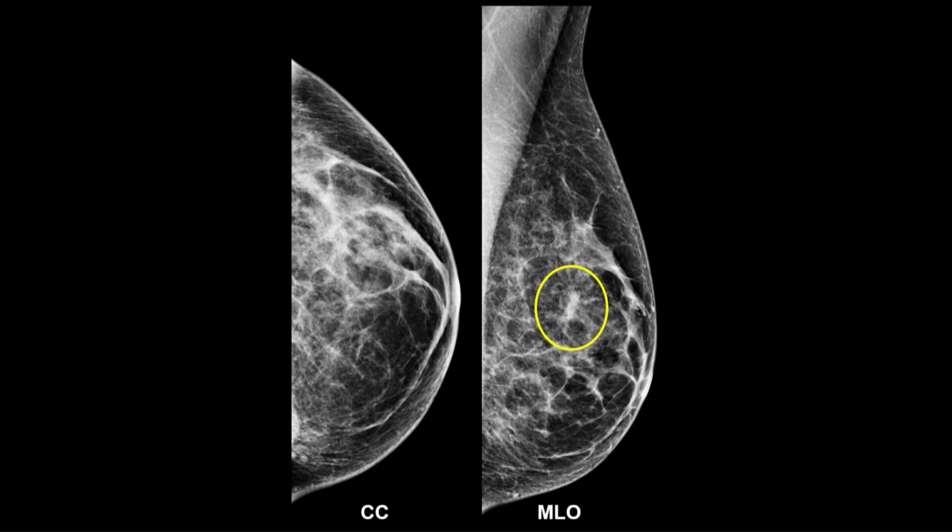It's just like when you're doing tomo, and tomo gives you enough information so you don't need to do diagnostic mammography. You can go straight to ultrasound. It's the same idea, but this is in reverse. With that one, you eliminate the mammo, go straight to ultrasound. With one view findings, you do the mammo first and you eliminate the ultrasound. It just doesn't help. Unless you want to do screening ultrasound for dense-breasted women, that's a different subject.